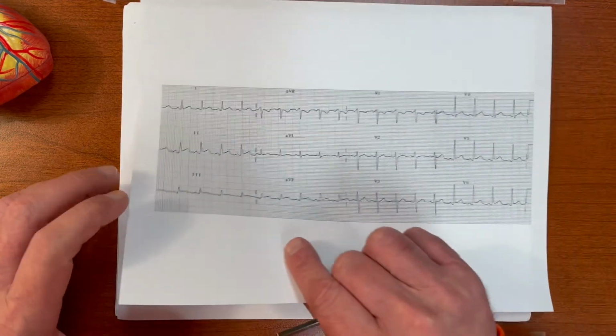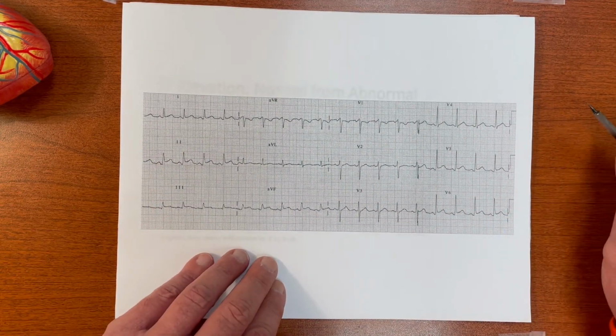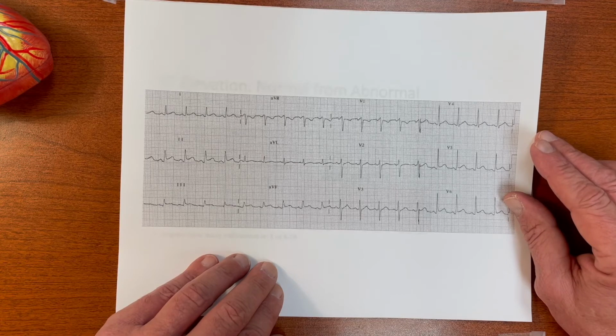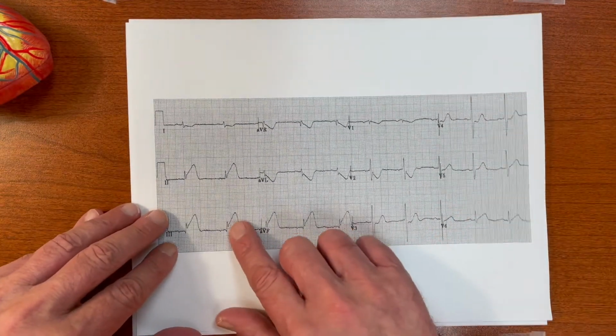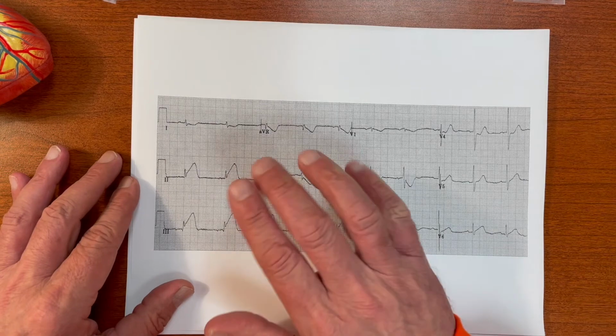this EKG, which we look at, and the first thing we notice is what? You have to really look hard to see if there's ST segment elevation, by comparison to this EKG where it jumps out. So that gets back to degree. It's not subtle.